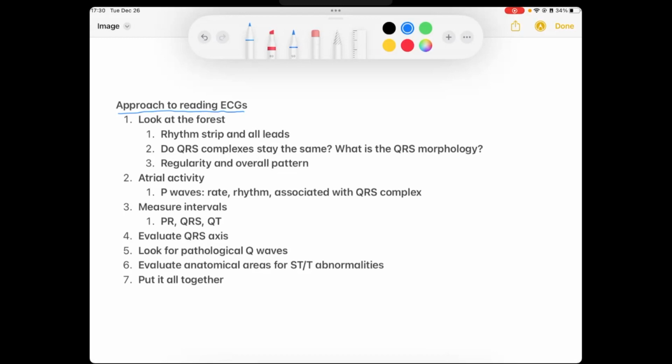And so understanding that, this is my approach to the EKG from a functional perspective, and I kind of use the anatomy of the heart to guide me, because that's what I care about: what is the electrophysiology behind this heart's rhythm, and is it causing the heart to work effectively, or is it causing the thing that I'm looking for in a patient?